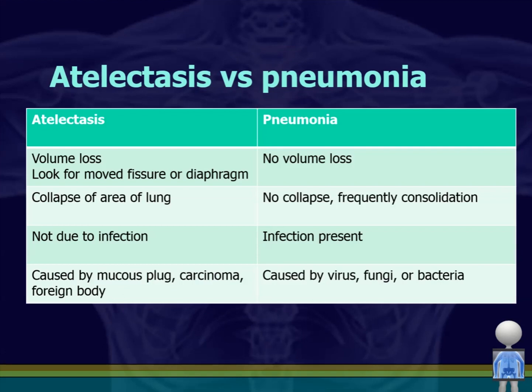And that only occurs in large atelectasis. So the most common atelectasis you'll see will be small plate atelectasis that's due to a post-surgical situation, or somebody's been in bed too long and they just haven't taken those deep breaths, and small parts of their lung have atelectasis. Now, those will not have volume loss, but large atelectasis will have volume loss, and that will be a great factor and key in determining the difference between a pneumonia and an atelectasis as well.